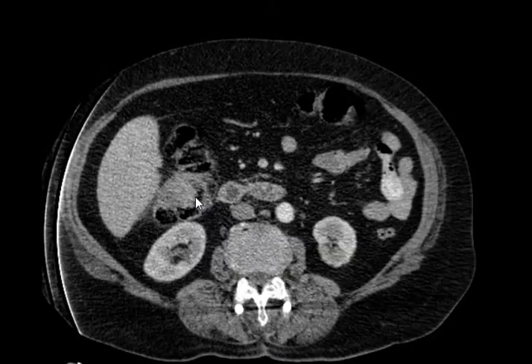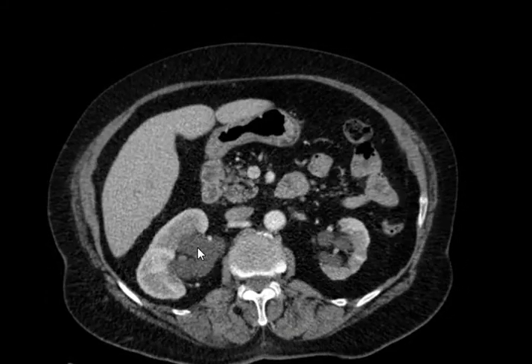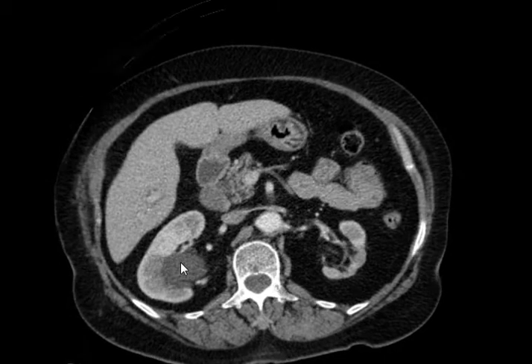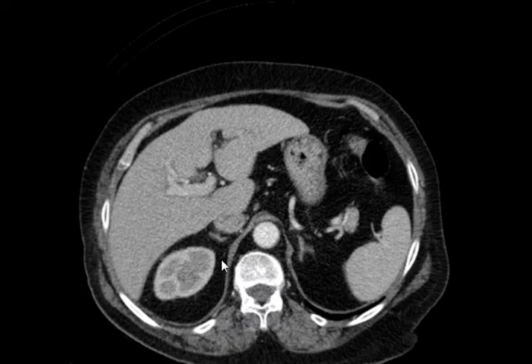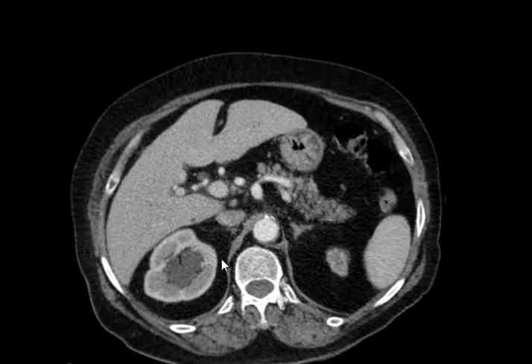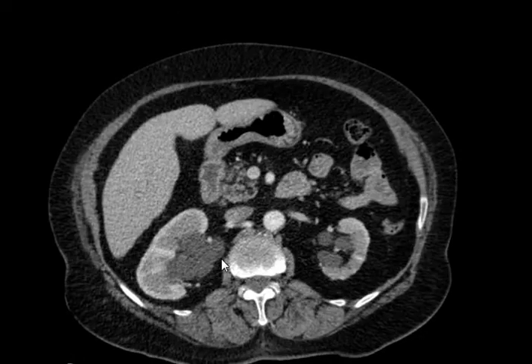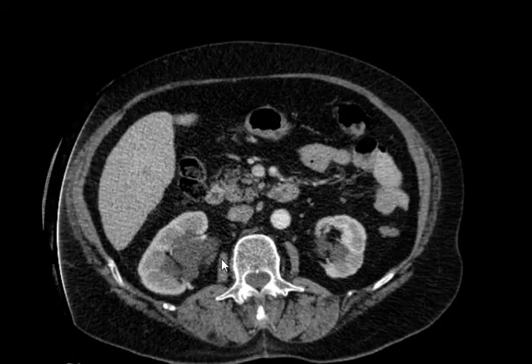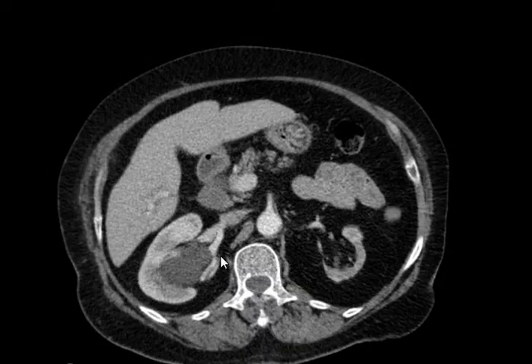Regarding the kidneys, we agreed there are two kidneys. One is larger than the other. The left is a little bit small. Both of them have multiple parapelvic or peripelvic cysts that simulate hydronephrosis. We see this a lot, and unfortunately a lot of times by ultrasound we report it as hydronephrosis, and the patient ends up getting a CT scan for absolutely nothing.